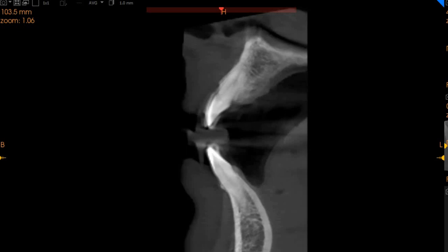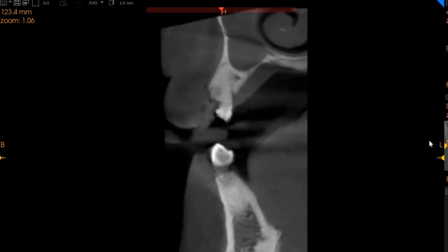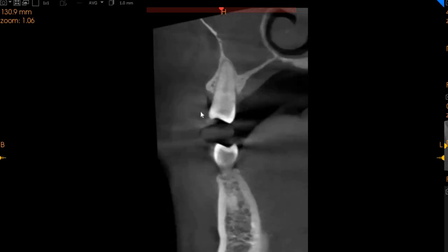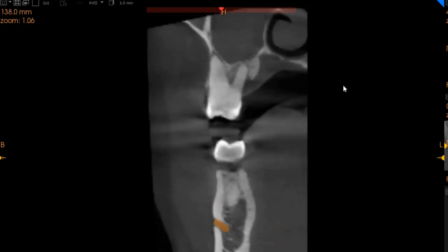Moving to the upper central incisor, better bone stability. The lateral is good, the canine is good. The first premolar has a class 5 region with bone loss present here as well. This is the second premolar, better, but this also has PDL widening, not as much as the right side. You can also see sinusitis again on the left maxillary sinus as well.